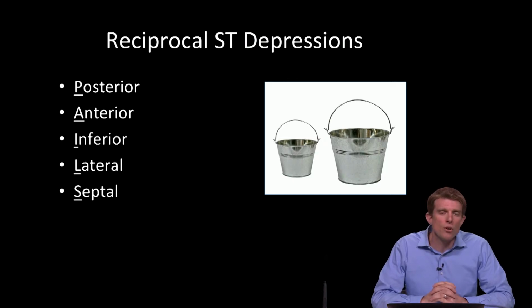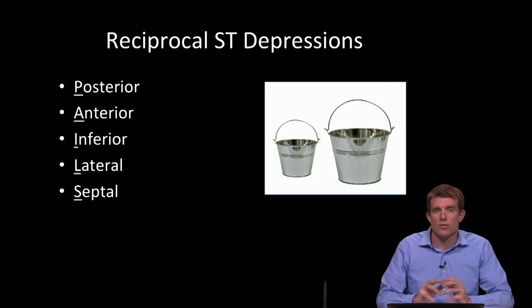Why is it important to look for this? Well, it increases the specificity of that ST elevation as being due to an acute myocardial infarction if you have reciprocal ST depressions.